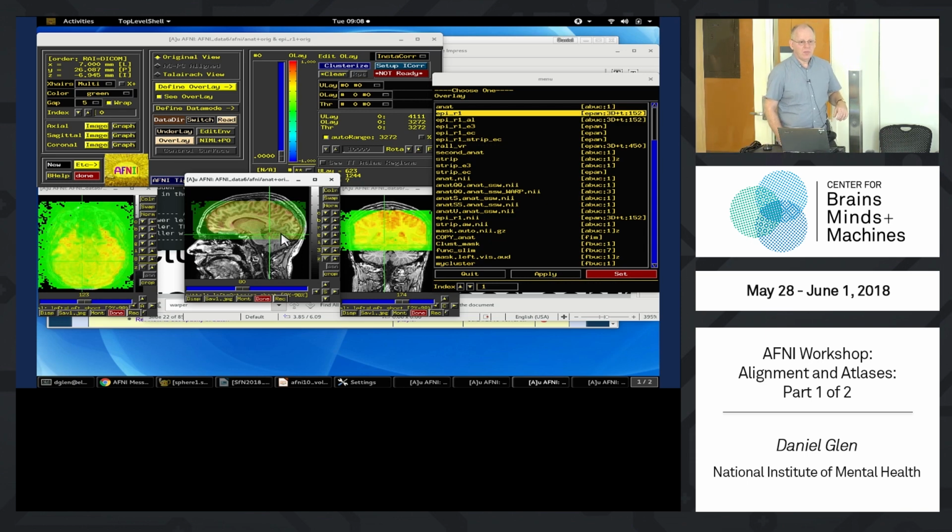My overlay is gray. The other ones are still green. So you may still have the 6 turned on. It's interesting that you can combine the 6 with the edges. But the first time I turned the 5 on, it also went gray, not green.